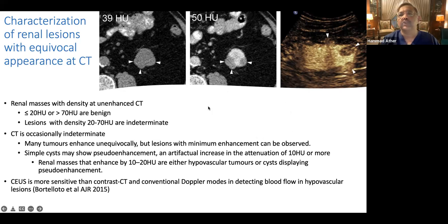However, from non-contrast CT to contrast-enhanced CT, we still are not sure, and this is still an indeterminate mass until we do a contrast-enhanced ultrasound, in which you can clearly see that there are 3 separate lesions which are contrast-enhanced, and they are highly suspicious of a tumor.